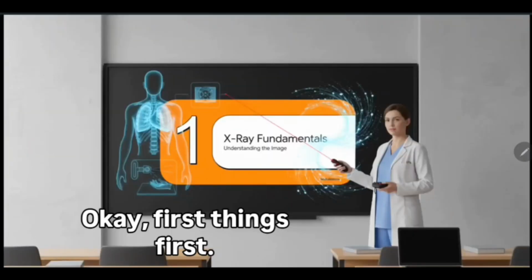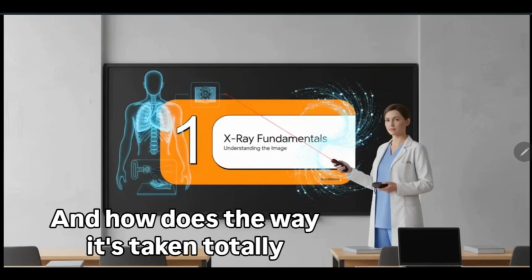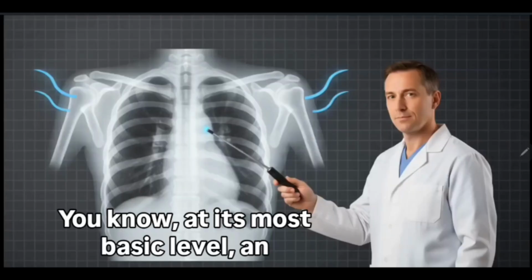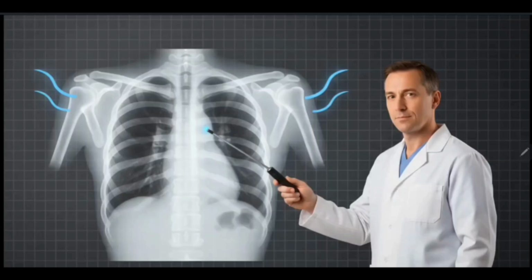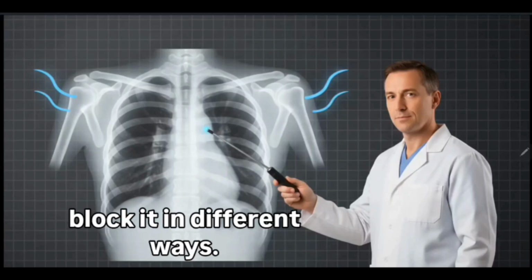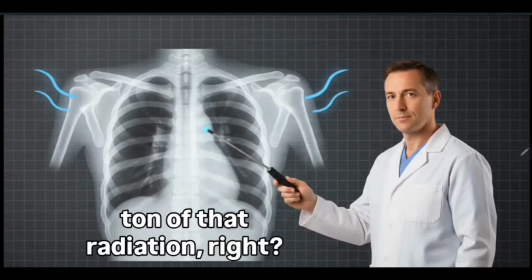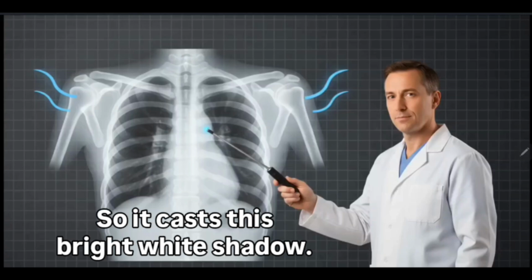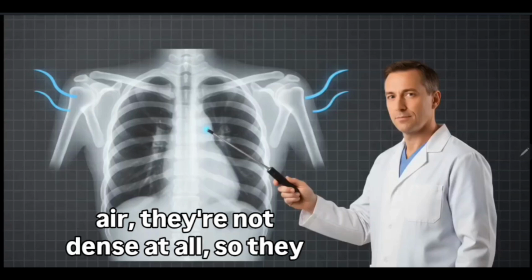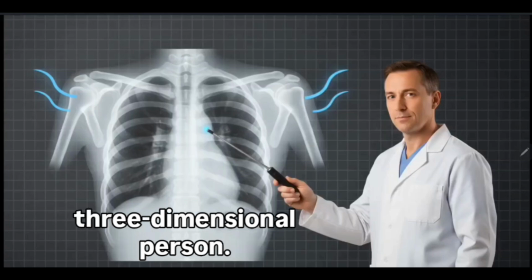Okay, first things first. We've got to understand what we're even looking at. I mean, what is an X-ray? And how does the way it's taken totally change the image we see? At its most basic level, an X-ray is really just a shadow picture. A beam of radiation passes right through the body, and different parts of you block it in different ways. Think about it. Really dense stuff, like bone, blocks a ton of that radiation, right? So it casts this bright white shadow. But the lungs, which are full of air, they're not dense at all, so they show up black. We're essentially looking at a two-dimensional snapshot of a three-dimensional person.